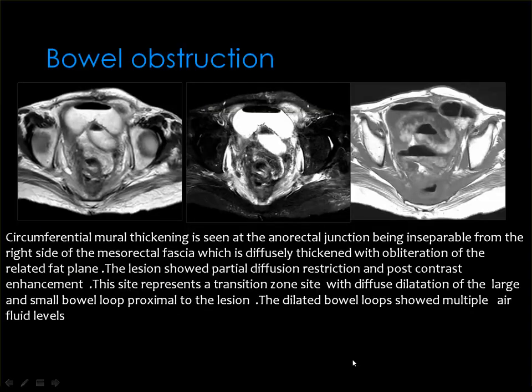And this patient presented with abdominal pain, distension, and vomiting, all the signs of intestinal obstruction after surgery for rectal cancer. And the MRI showed, at the transition point between the dilated loops and the normal loops, an area of irregular signal intensity, and it shows some faint contrast enhancement.